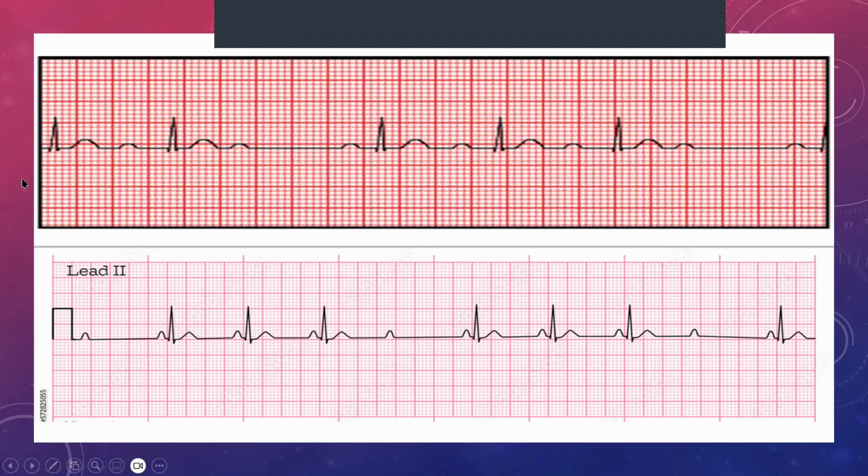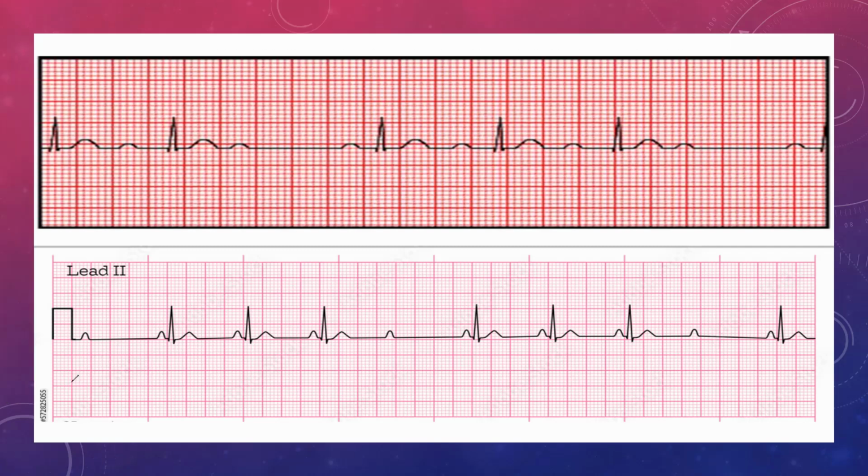So I'm just going to try and draw it to the best of my ability. Let's make this a bit thicker, sorry about that. It's quite thin. It might be difficult to see. So let's try and draw it out. An alternate that you may get, for example, is you may get a P wave, and then an elongation, and then you get a wide QRS complex, and then your T. And then again, you would get a wide QRS complex, but it would be more or less the same. Your PR interval again is elongated, but these two distances would be the same, and it would continue in this vein. All right. So that's another potential of what a Mobitz type 2 looks like.